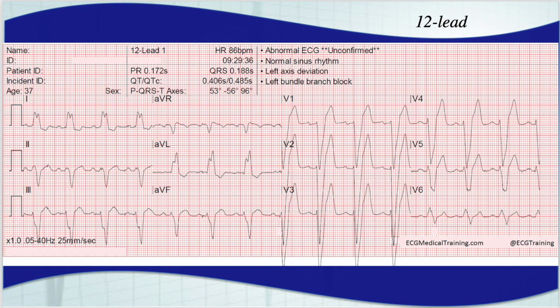And on this 12 lead, I'm using this one as an example of why the original Sgarbossa tool is not that great. Because look how big these QRS complexes are. Look how deep they are. What happens with a left bundle branch block is the deeper the QRS complex, the more elevation you will have as a normal variant. So even though utilizing the original rule, we may get more than 5 millimeters of ST segment elevation here, unfortunately, it's not highly indicative of it being a true MI because this QRS complex is so big.